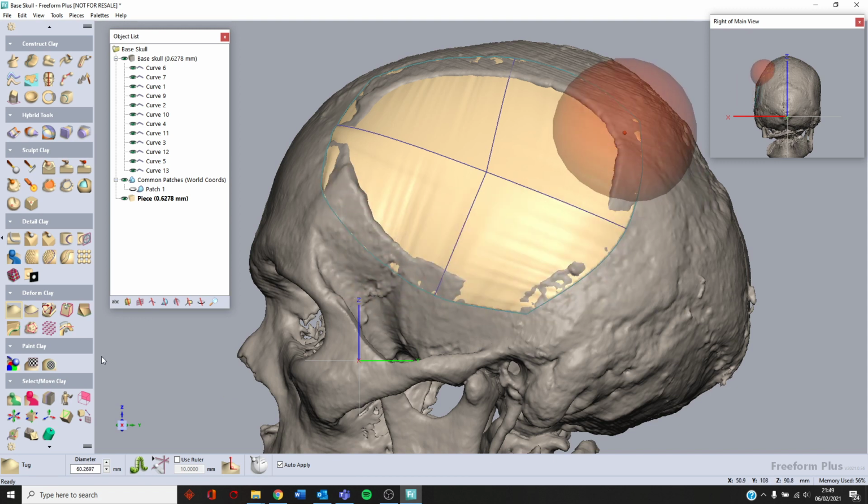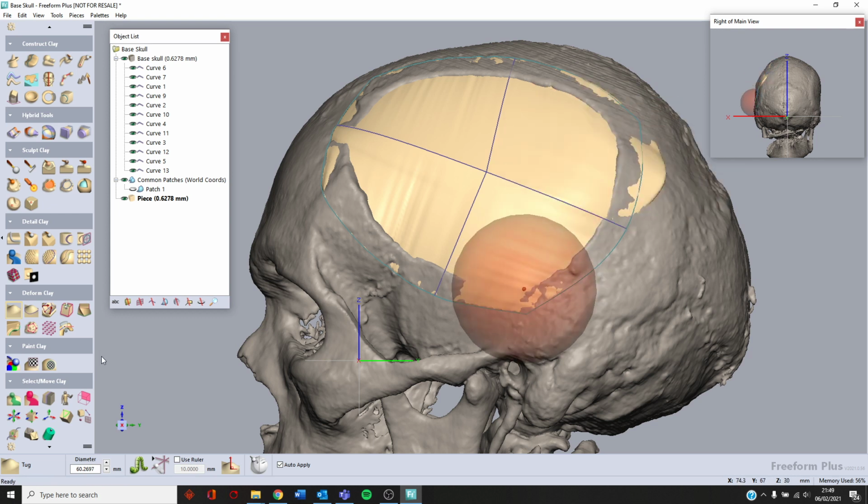And this is a little bit of a manual edit, so you can spend quite a bit of time in here trying to adjust it. All I'm trying to do is to get this patch flowing nicely and merging with those edges of the defect as well as potentially can. I'm not quite fussed what's happening underneath. I can stretch it, tug it, push it down, push it inwards, as it will be deleted anyway. But those edges I try to get as accurately as I possibly can.